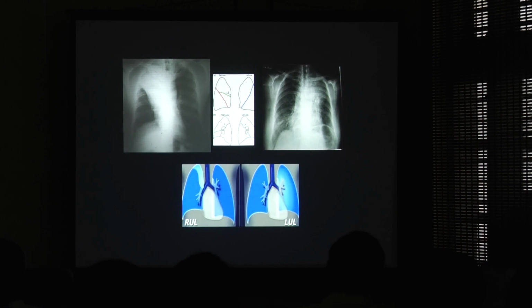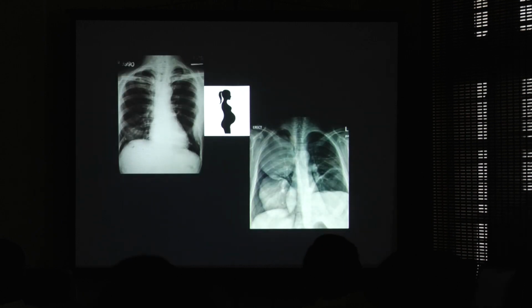So, you have to make a diagnosis of left upper lobe collapse with it. Here, the fissure which moves is the oblique fissure in the left upper lobe, and the oblique fissure usually will not align tangential to the X-ray beam. So, we will not get a well-defined lower margin for this case. So, please carry this image with you so that you don't miss any case of left upper lobe collapse.